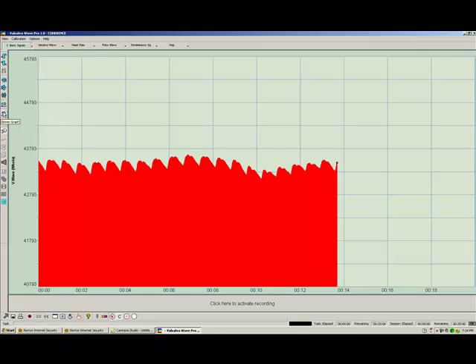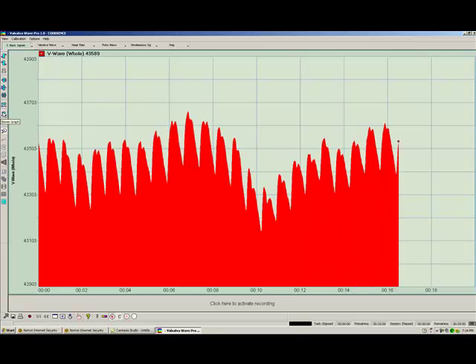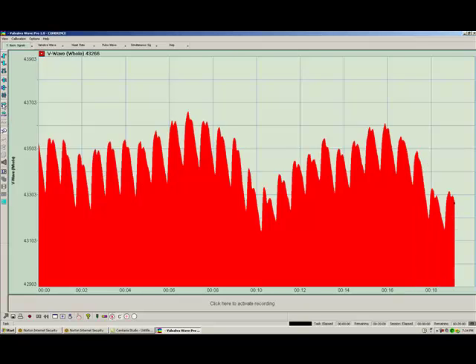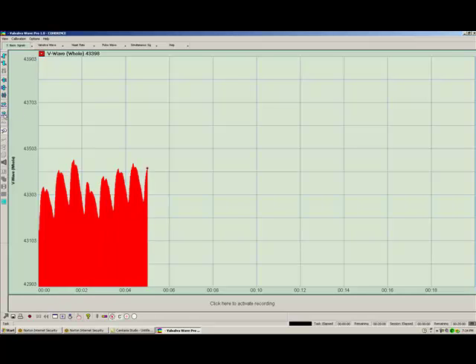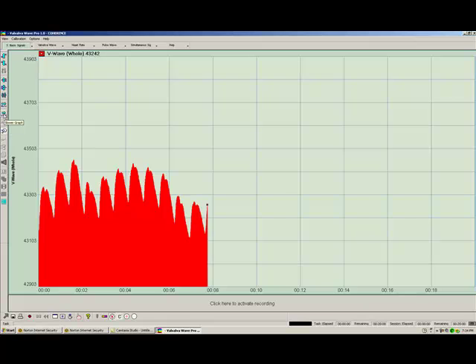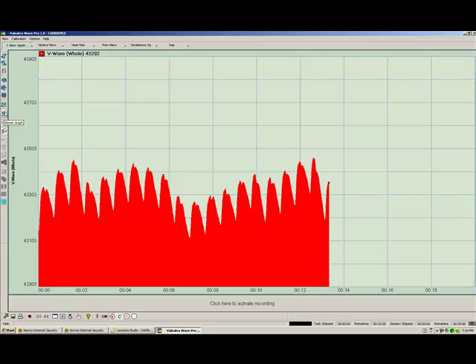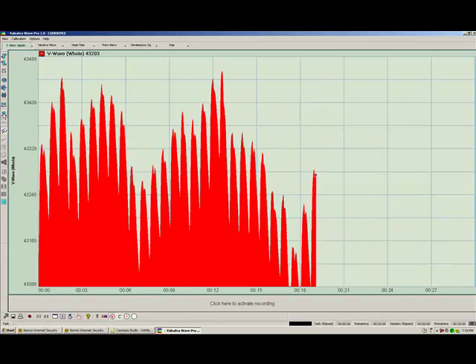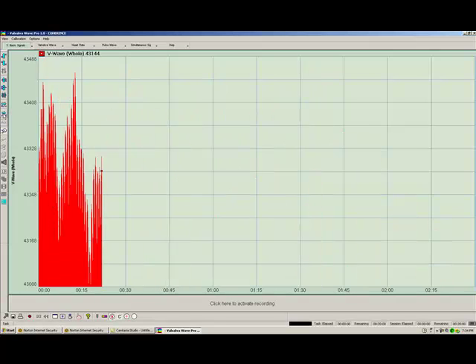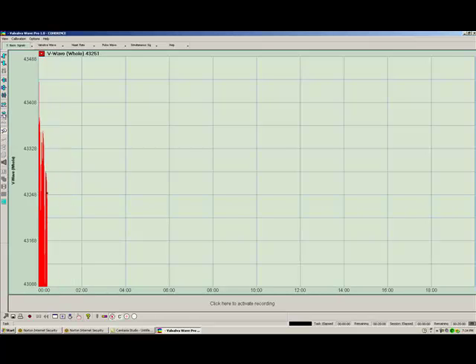Of course, in a biofeedback session, we have to choose these things correctly. It's important in the beginning that clients are able to see that their actions affect their biometrics in real time. So we want a relatively fast screen when people are just learning. But after they have good control and a solid understanding of how to do this, then we could go for a much longer screen. Maybe one that even extends over a period of 20 minutes, like this one. The fast valsalva wave is not a good example of this kind of screen and its usefulness, but a line graph would be.